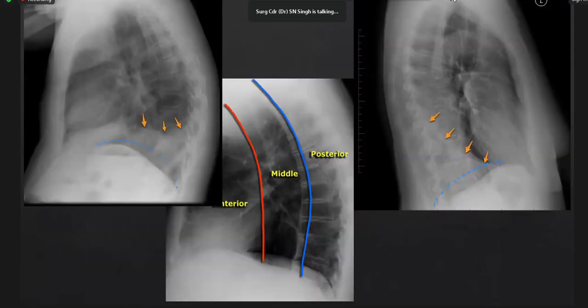I think left and right I have already discussed. So there is one collapse over here. If you can see, this is one collapse. This is the minor fissure, one of the minor fissures. Otherwise we don't have time to discuss all this. But yes, on the right side there is one collapse, and on the left side there is one collapse.